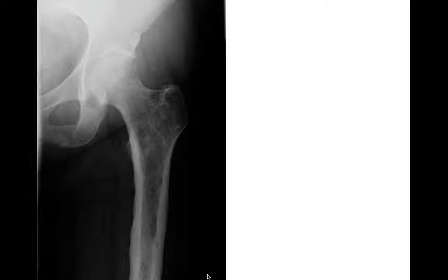Could this be an aggressive infection? Sure. I really wouldn't include much else in the differential in this case. Mets and myeloma are going to be the top. This turned out to be metastatic breast cancer in this case. Multiple myeloma would look identical.